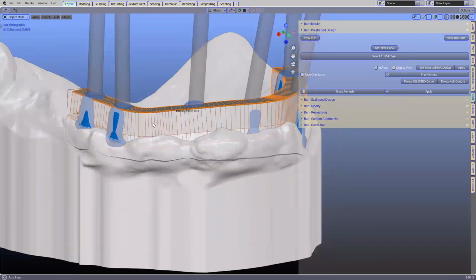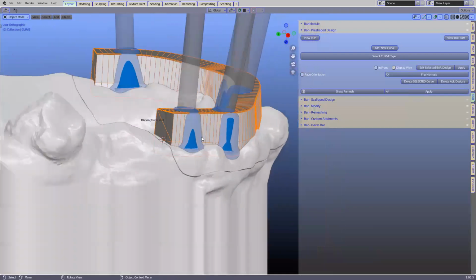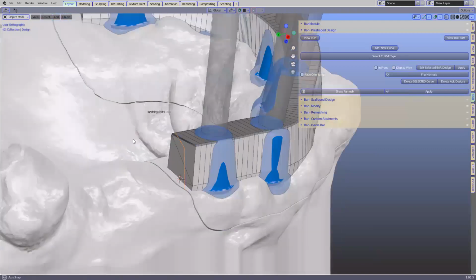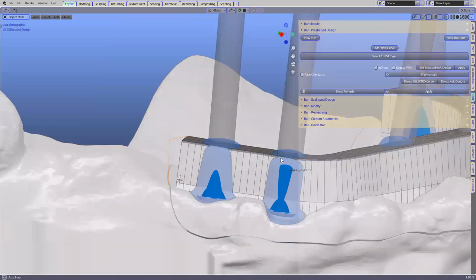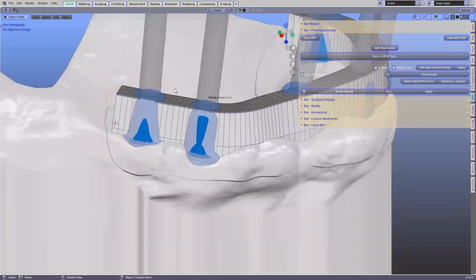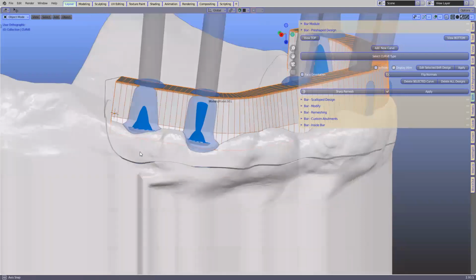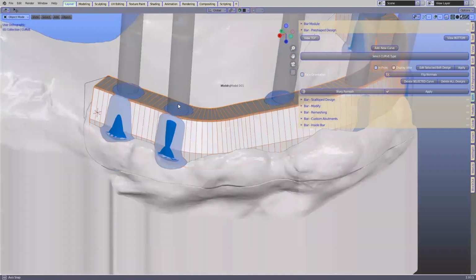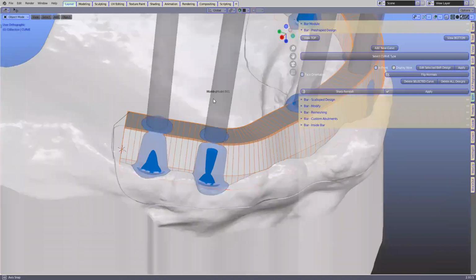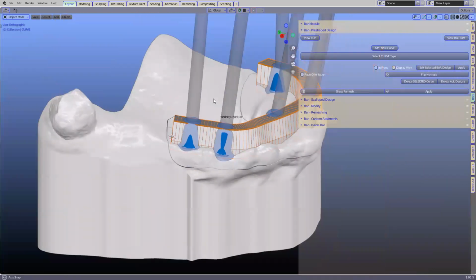So this slopes at exactly 2 degrees. Here's your design. It gets brought into the scene, and then it extrudes in the Z direction so that when you look at it from the top, it's exactly parallel, or exactly with the Z direction.